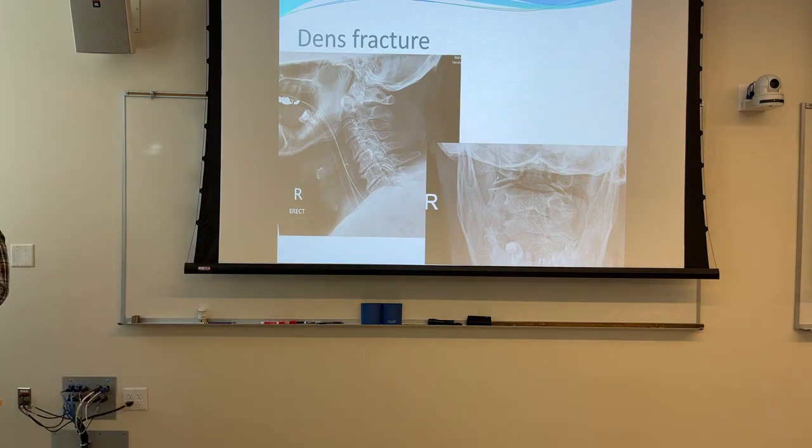So what we've got here, we'll count up from the bottom, roughly count what we've got here: 7, 5, 4, 3, 2, and then 1, right? But look how nice and aligned these are, and then that one just kind of falls off backwards, right? So the benefit of the lateral is you can see most of these fractures on the lateral. The lateral is better for diagnosis of a potential C1 fracture or C2 fracture, dens fracture, than the Fuchs is.